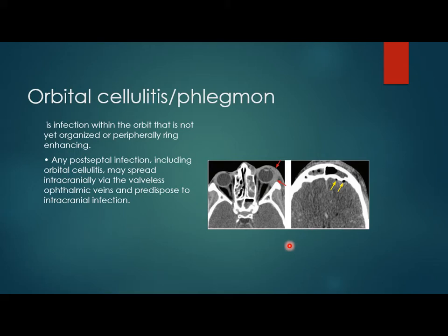So the important thing here is there is no abscess, there is no wall. It's less severe than that. It's just soft tissue edema and infection.